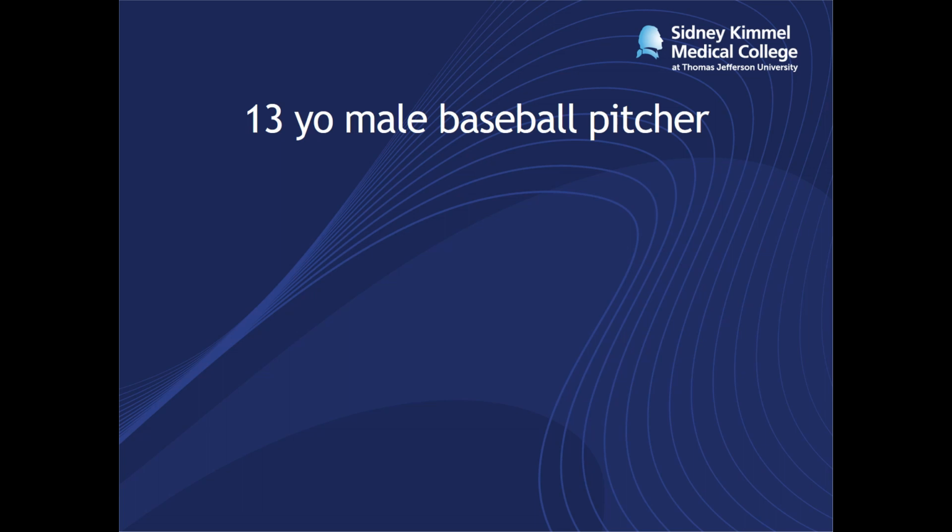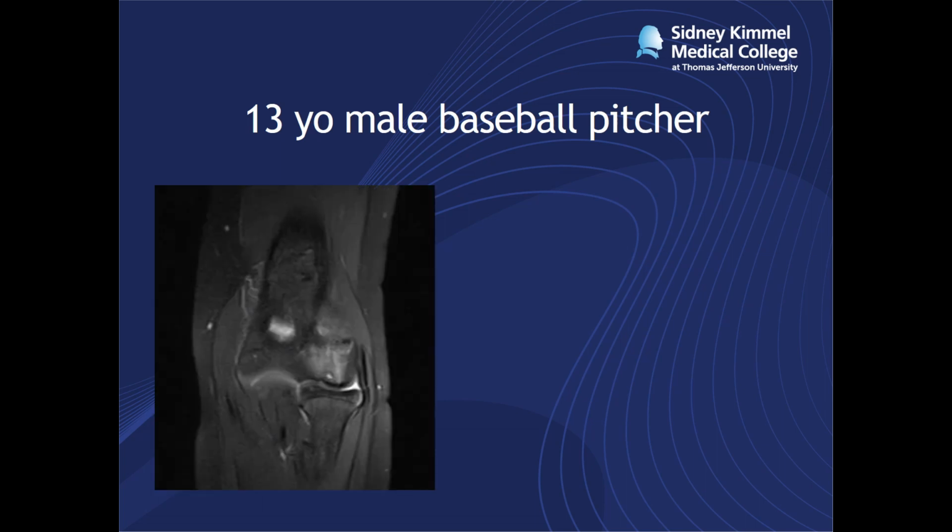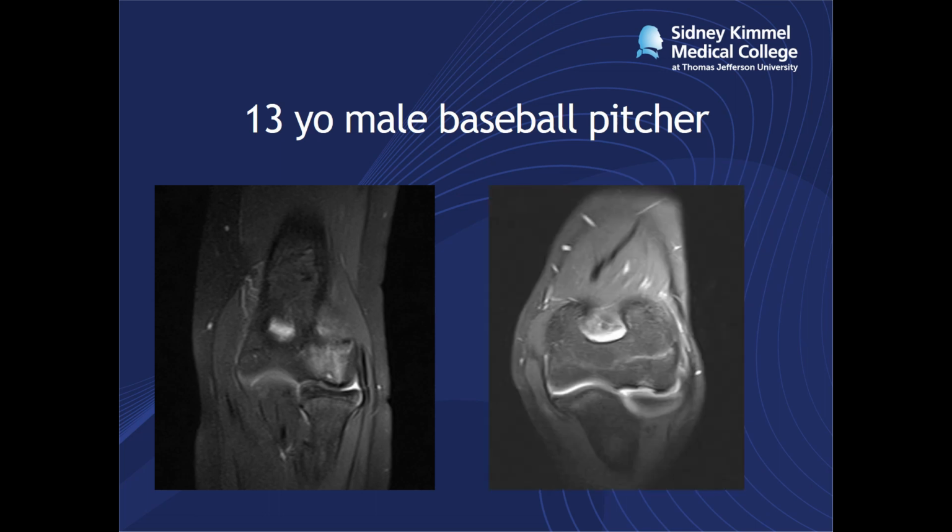Curveballs and breaking balls, anything where you have a snapping motion in the throw, in order to add an extra element of motion on the pitch, can lead to injury. So I think it's important to hold off on letting kids throw those kinds of pitches until they're physically capable of handling them. So here in this example, we have the same patient with a coronal fluid sensitive sequence, and then the follow-up image 6 months later.